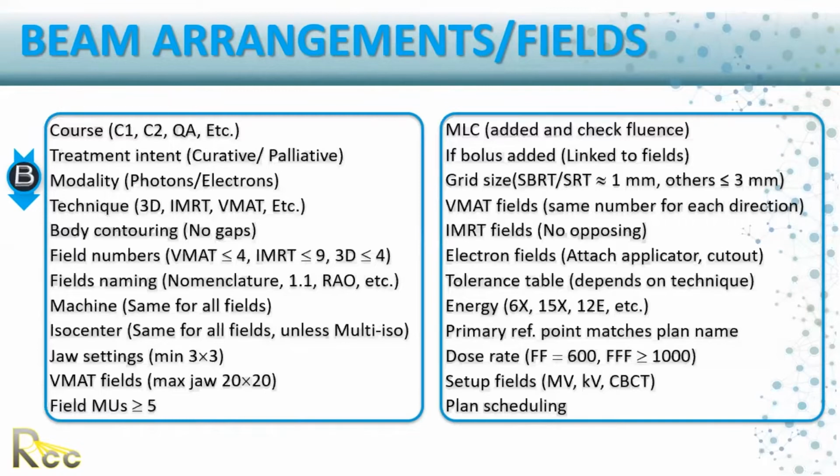When you are treating an area in the neck or thorax, for example, one should ensure that the beams are not entering through the shoulders, arms, or exiting to the oral cavity unnecessarily. For intensity modulated radiation therapy, IMRT plans, one should consider the number of fields and their point of entry through the body and fluence pattern. Assessing the field arrangement and collision may subsequently become important if target coverage or organ at risk limits are not optimal and may be improved with additional fields or different beam entry angles.